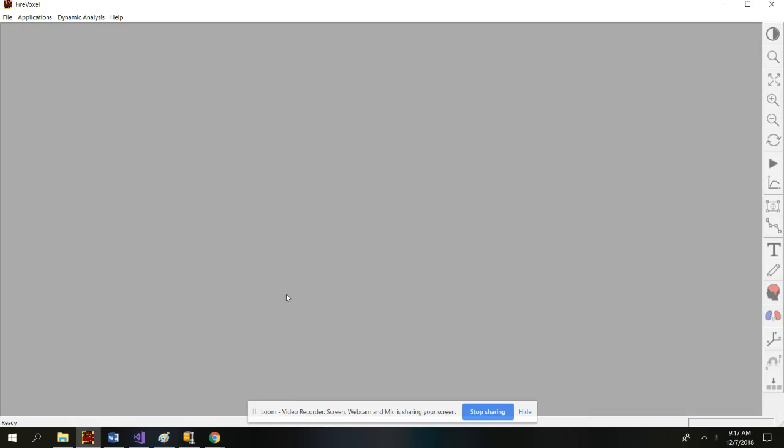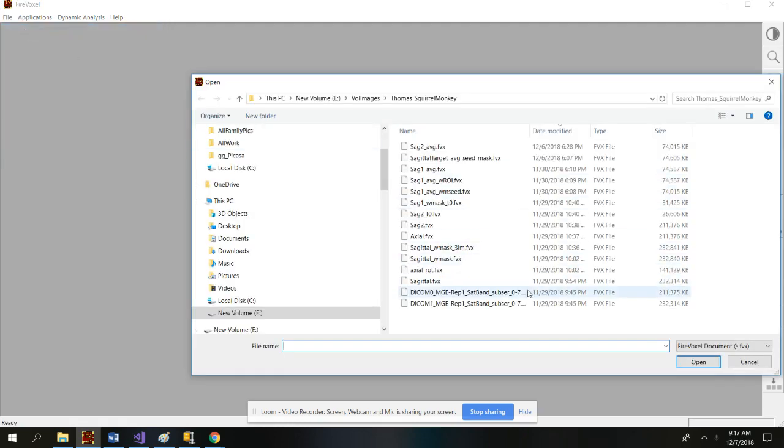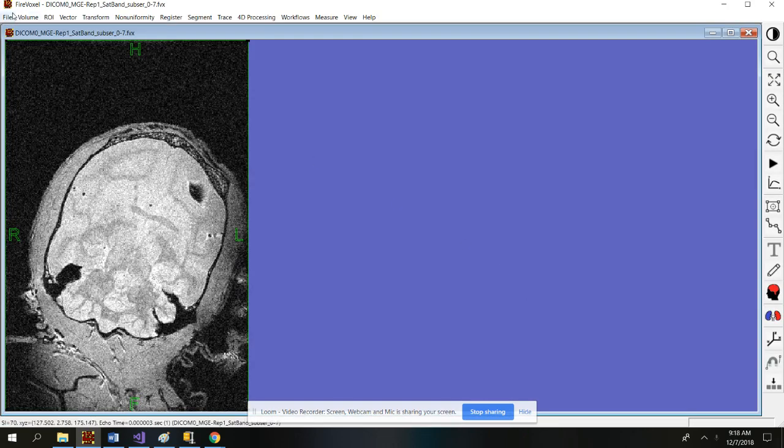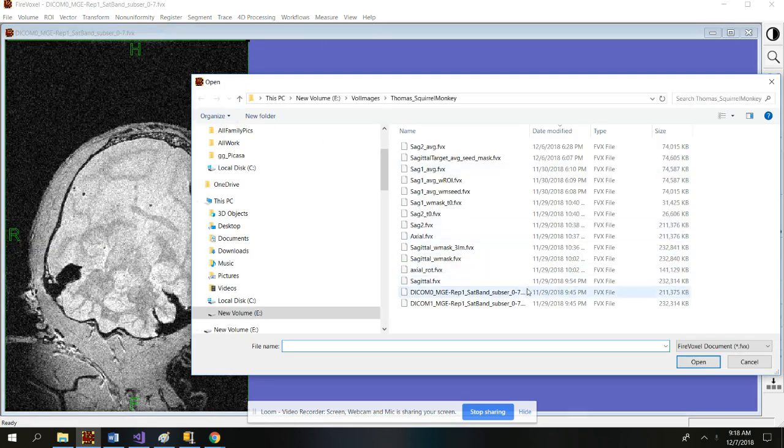Hi, welcome to FireVoxel. In this video, we'll try to demonstrate how to register two monkey brains. Let's start with the data that I received from monkey researchers.